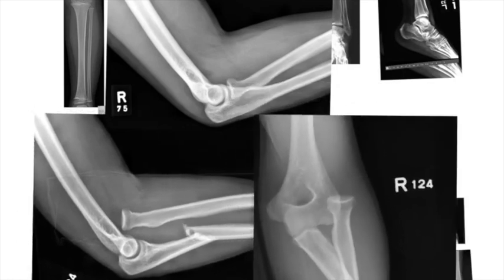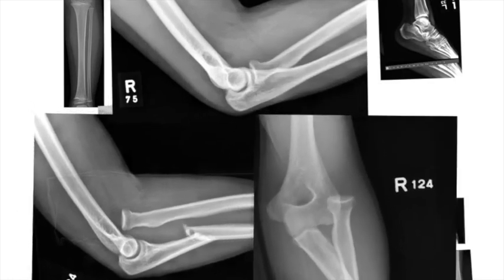Now, in these 2 images on the bottom, you see the cortex and say, okay, not smooth, right? You're following smooth, smooth, smooth, not smooth. And you've clearly identified a fracture. And then when you go to look at the alignment, you see that this ulna is not aligned. And if you know the normal anatomy of the elbow, you'd realize that this radial head is not where it's supposed to be. It's supposed to be here. So that is dislocated. So here you have a fractured dislocation, and you can see that on this AP view where you have the ulna and then the radial head is completely dislocated.